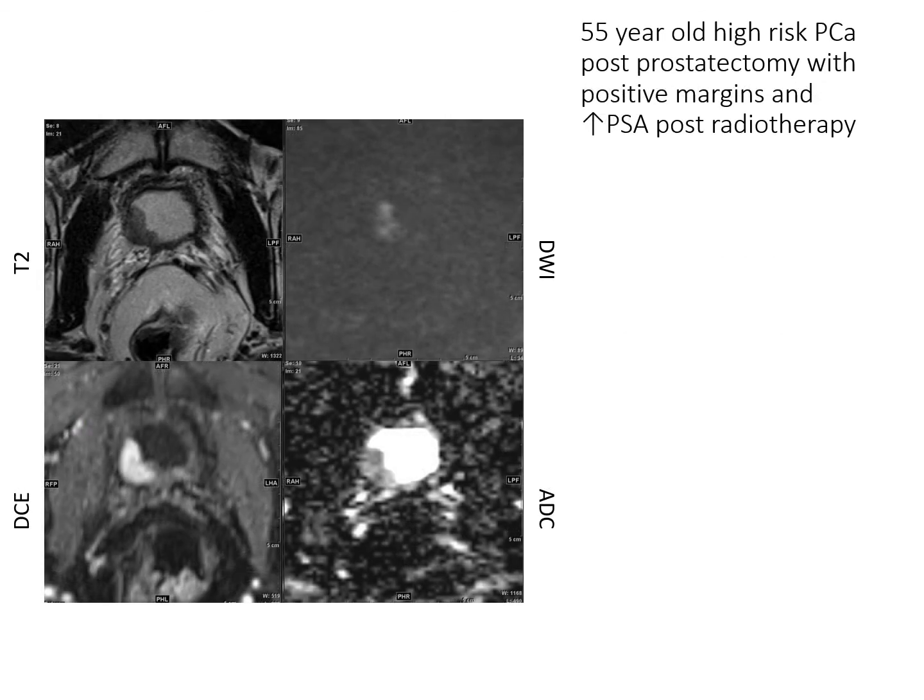Now this is quite a nice case. This is a case where the patient has had treatment, so PIRADS is not relevant now, but they had high-risk prostate cancer, they had prostatectomy and positive margins, and despite radiotherapy, the PSA is climbing. So the question is, is there recurrence?